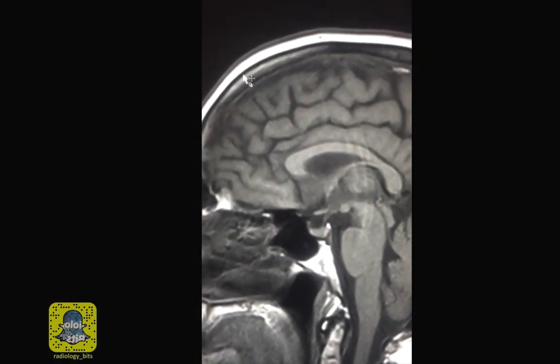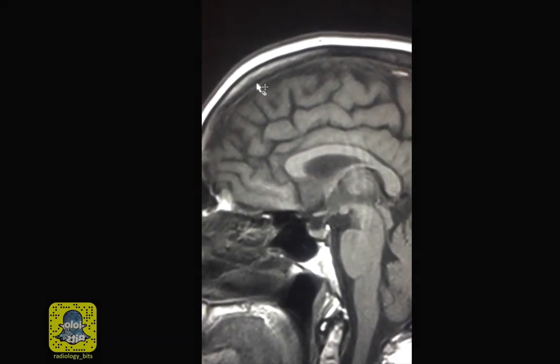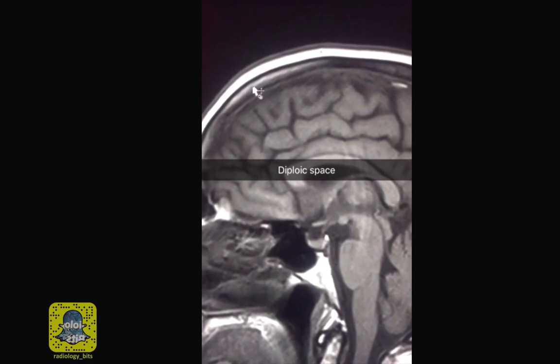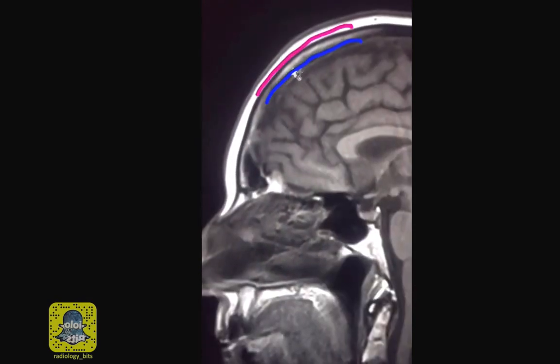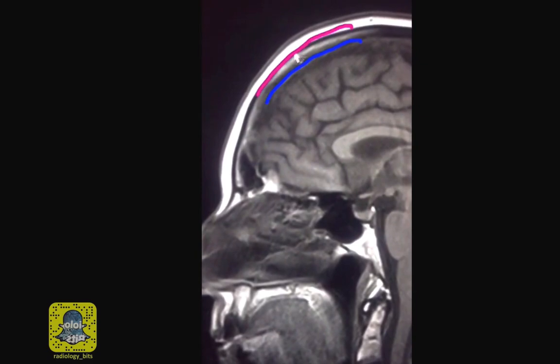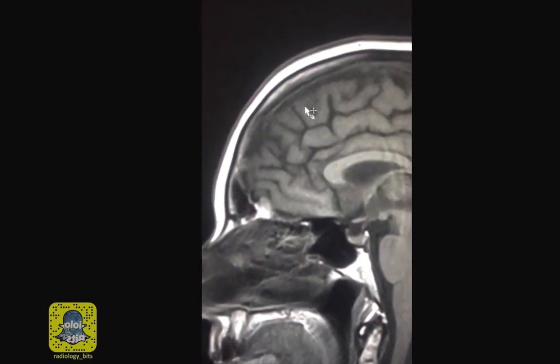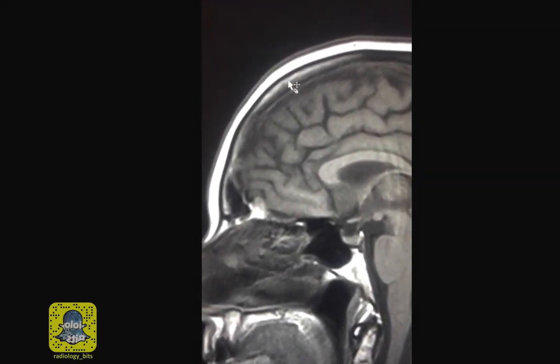In more detail, this is the outer cortex, which is very dark. This is the similar dark inner cortex. And this is the bone marrow, which is contained in what we call the diploic space. So this diploic space is just a fancy word for the marrow that's contained between the outer and inner cortex of the calvarium. Like any other bone in the body, this space contains marrow.